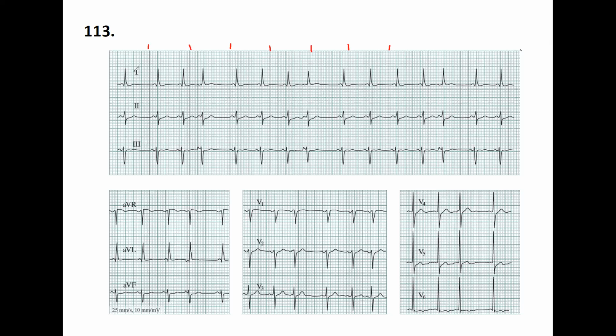Let's look at, for example, lead number 1. Lead number 1 is positive, yes? So we are on the left side, yes? Right side, no? Lead number 1 is positive, this is on the left side. Lead number 1 negativity means you are on the right side.